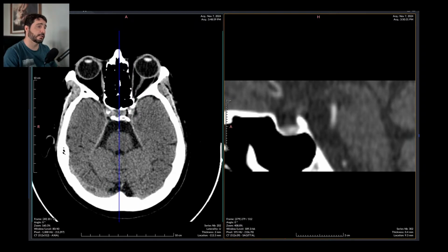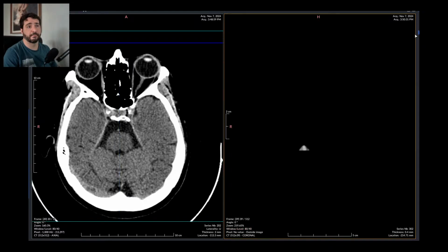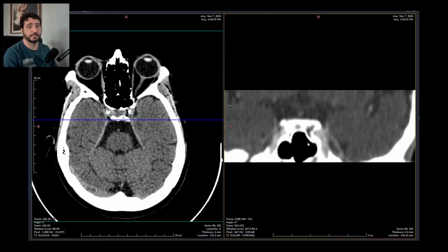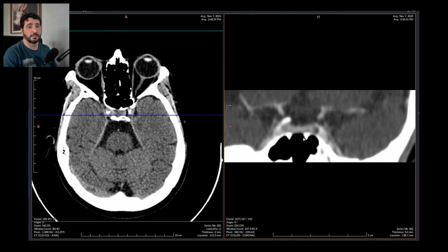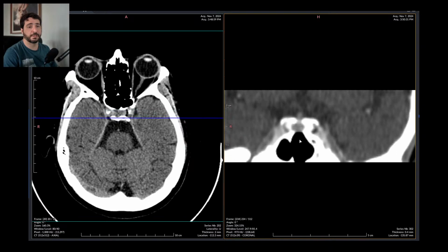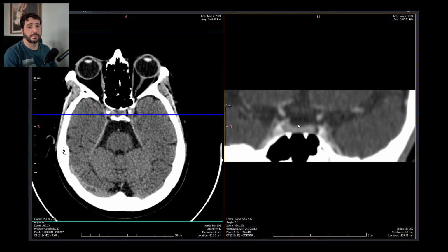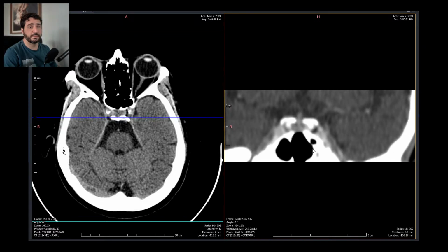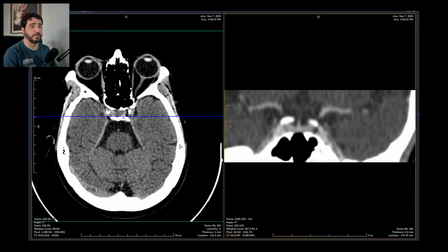So it enhances. They didn't even bother to do a phased enhancement, a multiple acquisition enhancement phase, because they know this is just a useless scan. It's supposed to be just this. It's supposed to be normal as always.